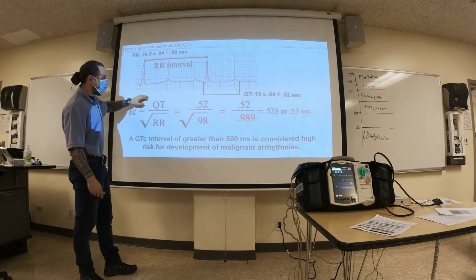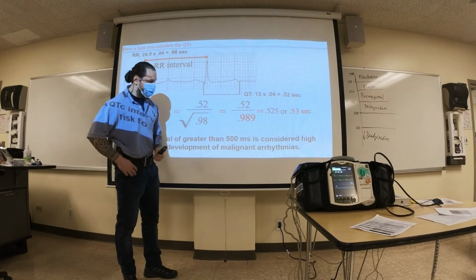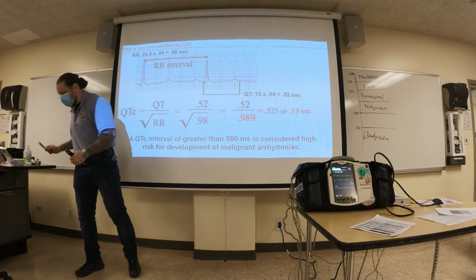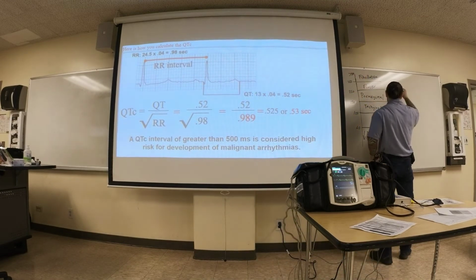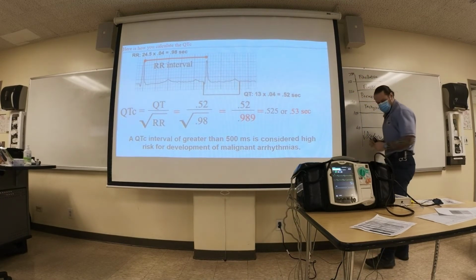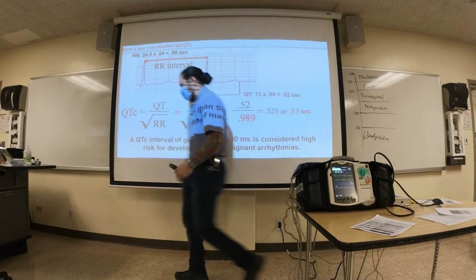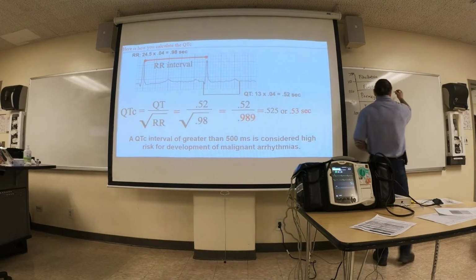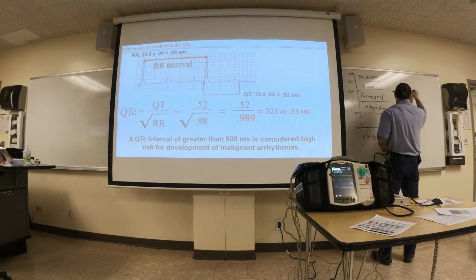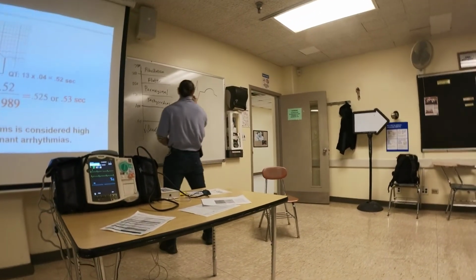And then he looks at your QT interval. If you remember from your EKGs, your waves: this would be the P wave.